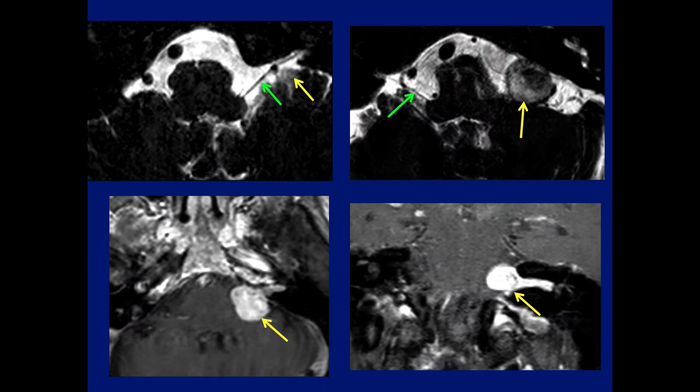Now, one of the things we have to be aware of, here's a large vestibular schwannoma in the cerebellopontine angle. Sometimes the inferior part of the lesion will affect the 9 through 11th nerve. So here on the axial thin T2s, here's the tumor, and the bottom of the tumor, which I highlighted here, is pushing on the nerve. You can see the nerve is on a stretch and slightly displaced anteriorly, because it's being affected by the inferior part of the vestibular schwannoma in the cerebellopontine angle.